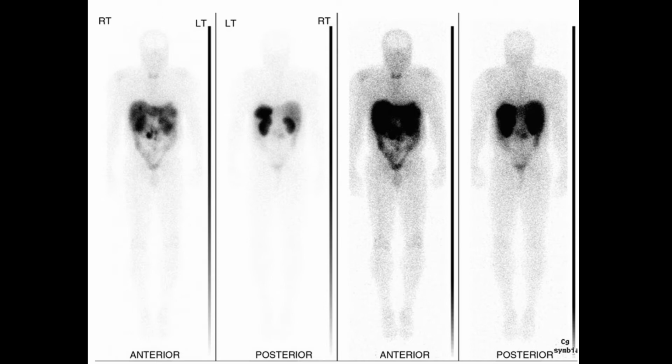Now if I am asked for the diagnosis of this case, I'll brief that I am given a contrast CT image of the abdomen, and a nuclear scan of the body, the indium 111 pentetreotide scan. Based on these findings, I can tell that there is a carcinoid tumor in the mesentery with a liver metastasis.